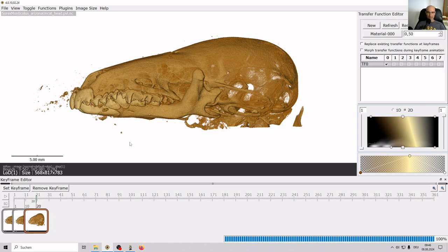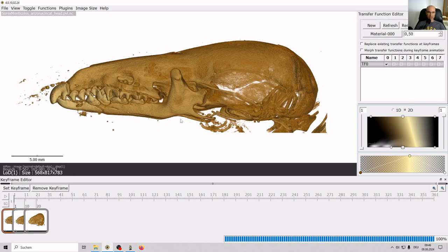And what I didn't save stupidly a moment ago was the label that I went to some trouble to create. So let's do that right now. We wanted to label the coronoid process of the mandible, which is this thing here that I'm circling with the mouse pointer. And I'm just going to make a 2-point line. I guess that's redundant, a line with 2 points, of course. That's shift left click to make those 2 blue dots that turn green when I hover over them.